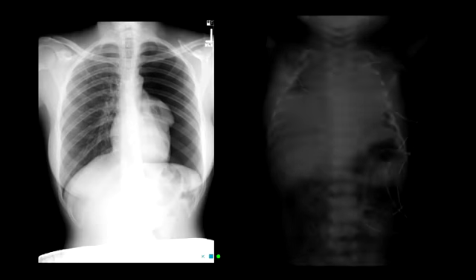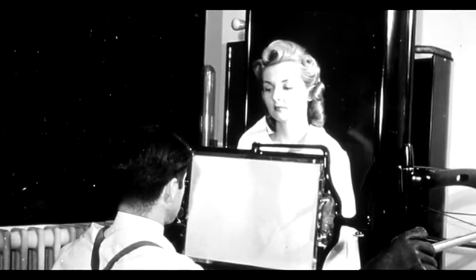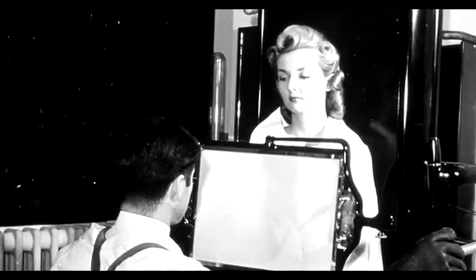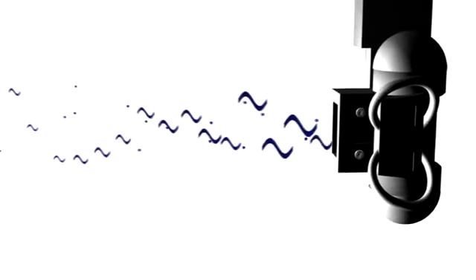The chest X-ray is the most commonly used diagnostic imaging tool in clinical medicine. As a medical student, resident, and practicing physician, it's important that you understand the basics of approaching the chest X-ray. In this tutorial, I will explain how an image is obtained and give you an understanding of what you should look out for when you're first approaching a chest radiograph.